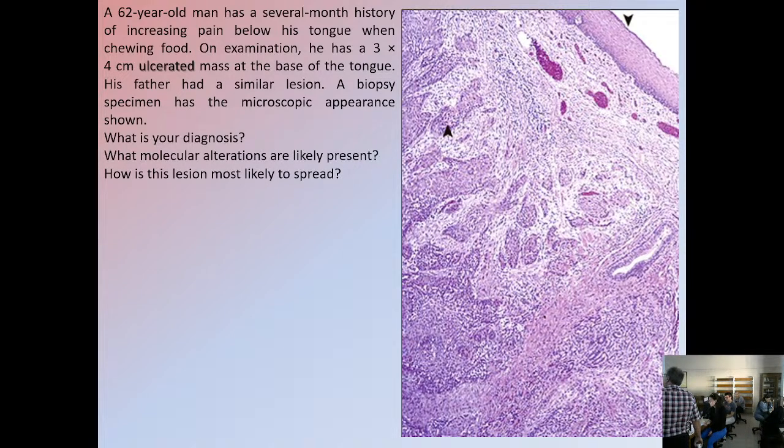Since the epithelium appears normal, it's not ulcerated, it is intact, and you see cancer underneath, what does this make a problem for the surgeon? The surgeon takes a biopsy or wants to remove all the lesion. So what is of crucial importance for you as a pathologist to tell him? If his margins are tumor-free.